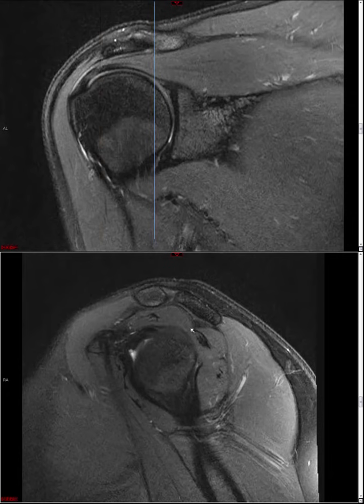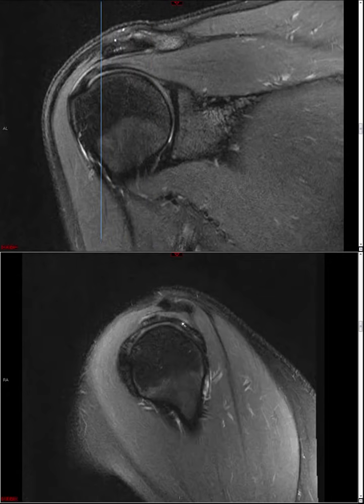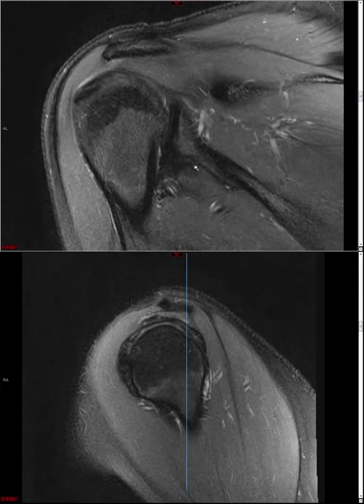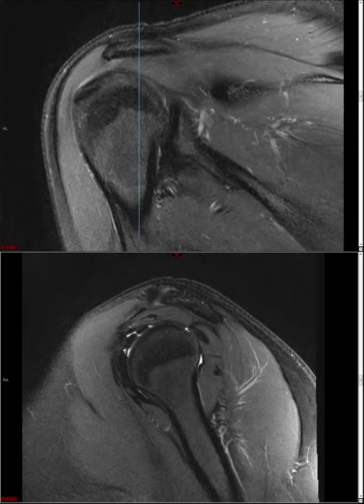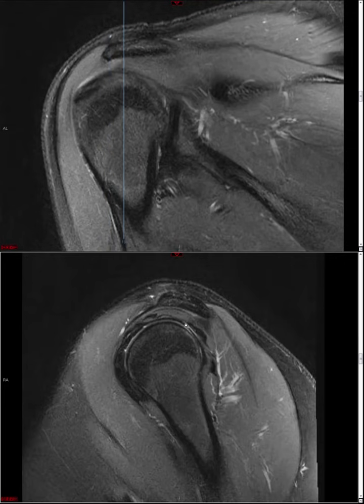In truth, anatomically, what happens at the so-called supraspinatus infraspinatus interval is that the fibers crisscross. So these days I actually don't spend too much time fussing about which tendon it is. If it's kind of near this junction area, I would just say there's a rotator cuff tear at the supraspinatus infraspinatus interval.